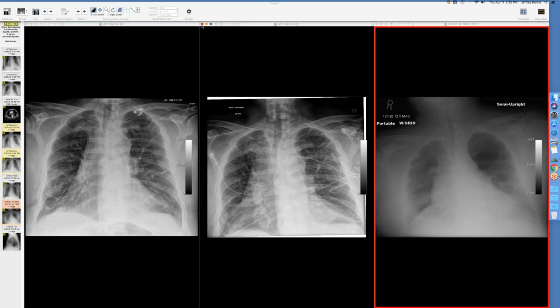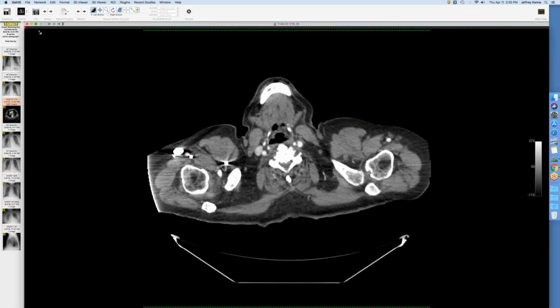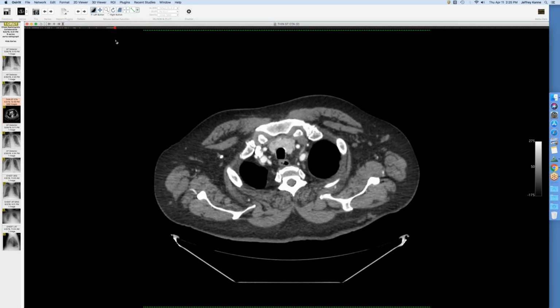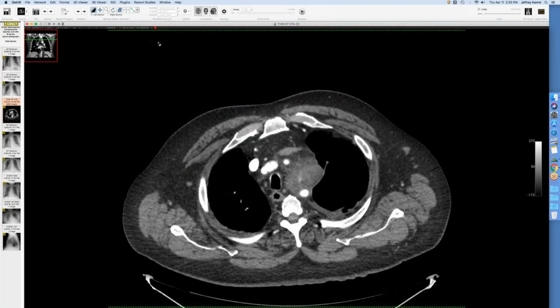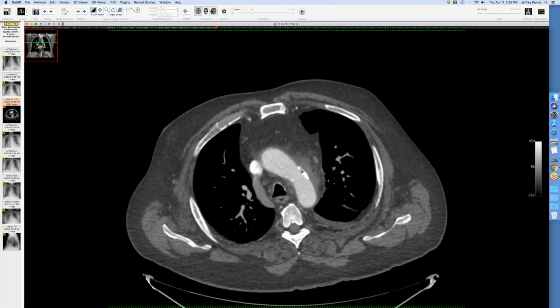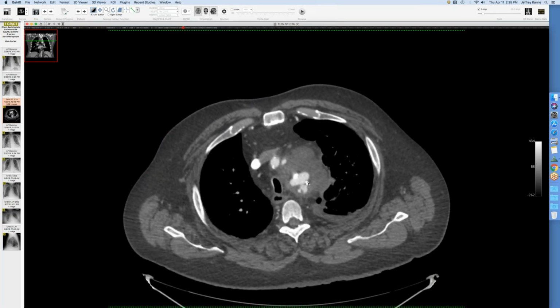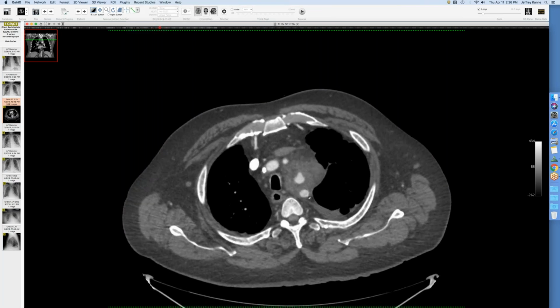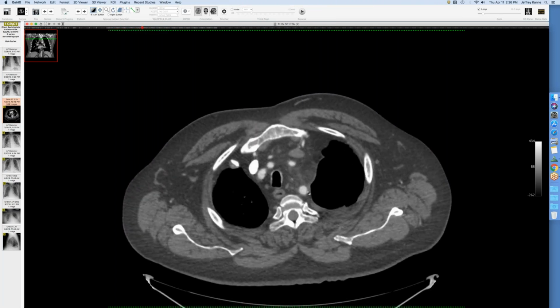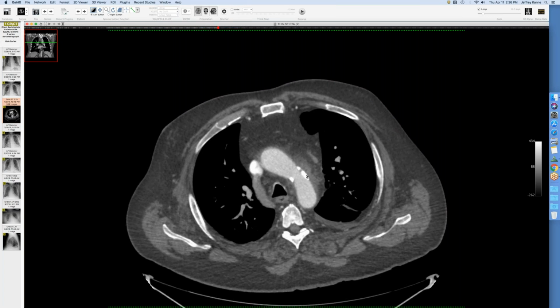Yeah, so let me show you what's going on. We'll close these and bring in the CT here. I got a CT because my colleague Chris Meyer raised the concern of an aortic problem and hematoma or something. And indeed, there you go. There's your aorta, and then there's blood, and then a little rupture. And it looks like it's right between this plaque. You can see there, and then there's just a little blood, and you see the arch vessels are preserved, but it definitely gets around the origin of the subclavian artery. But we've got this hematoma all mashed in there.